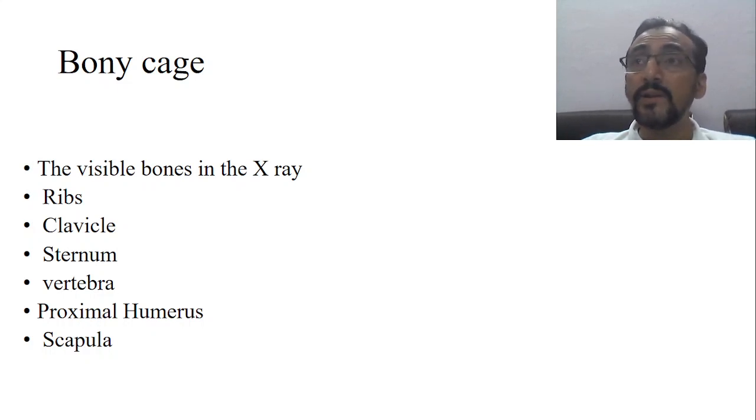Now you know that these ribs or bones are radio-opaque, so they are not radiolucent. The bone shadow will not come as black; wherever there is bone, the shadow will always be whitish. Now this bone shadow has to be differentiated from so many of the other white shadows, which may be there in the lungs or lung parenchyma due to some pathology. This differentiation is very, very important.